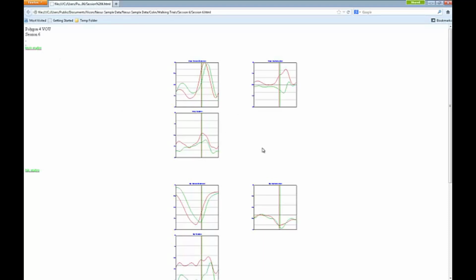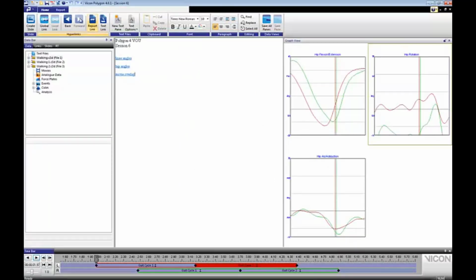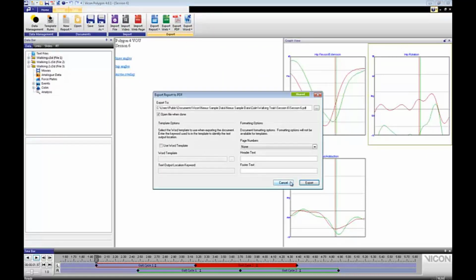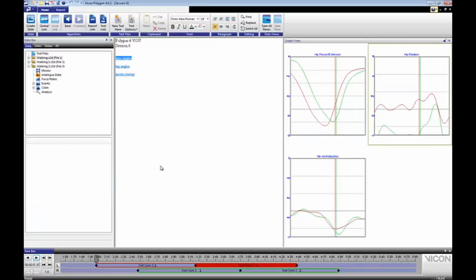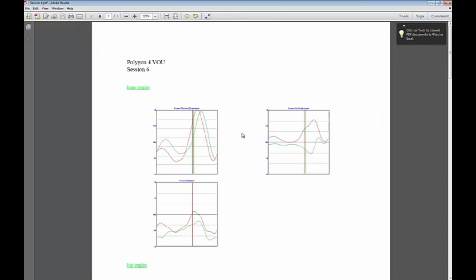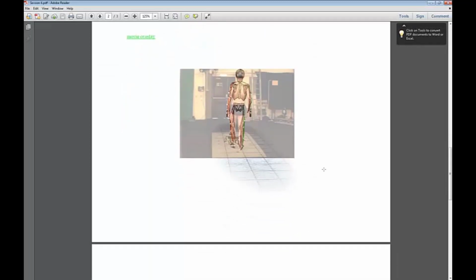Every time it comes to a link, it sends out the link images. And got all the way down. And if I would like to export to a PDF, again, same pop-up. Text with my hyperlinks and the movie overlay.